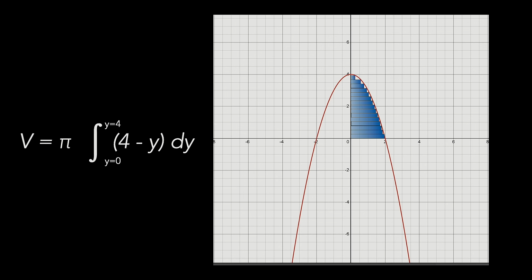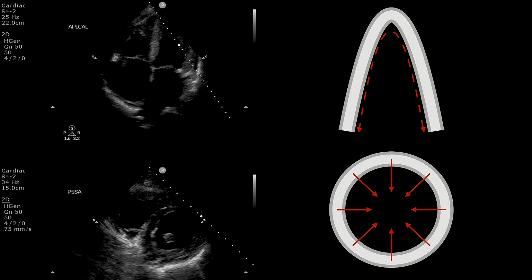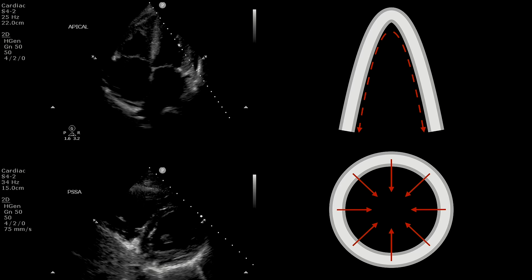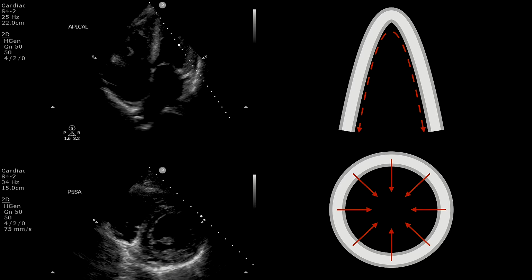It's measuring volumes in those two different components of the cardiac cycle, and then comparing those volumes and telling you how much was ejected from the ventricle when it was filled and when it was squeezed. And so getting back to this, we're looking at the volume change between systole and diastole. And when we put the math around that, that's what we call the Simpson's method.